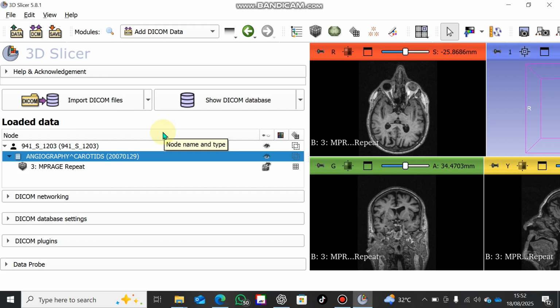This is how exactly you extract the brain tissues from MRI images. For any brain you can actually use it. I think it is much more applicable to MRI images and functional magnetic resonance images. If you have those kinds of images, it really works very well. So basically, this is what I have for you guys.